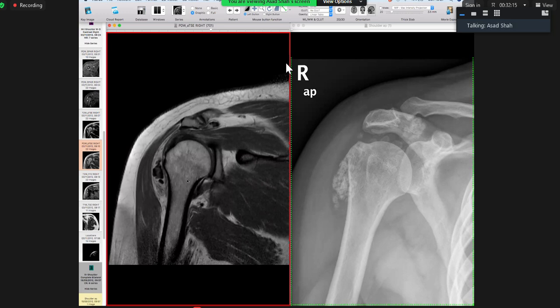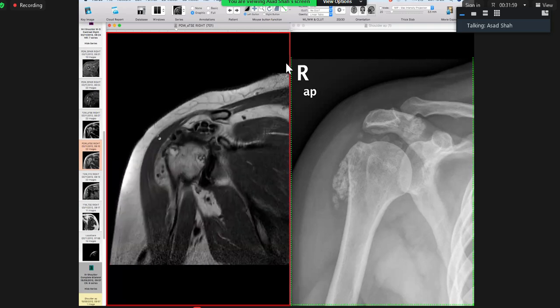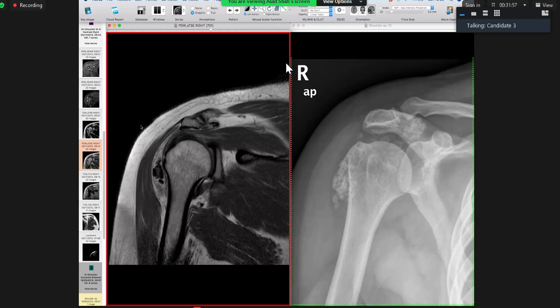So remember, obviously, when you think about synovium, you think about the joint, but synovium is around the tendons. It's around the bursa and all that. Bursa and tendon, they're all synovial lined tissues. So the same pathology can affect synovium anywhere. Thank you. So this is what typically looks like synovial osteochondromatosis.